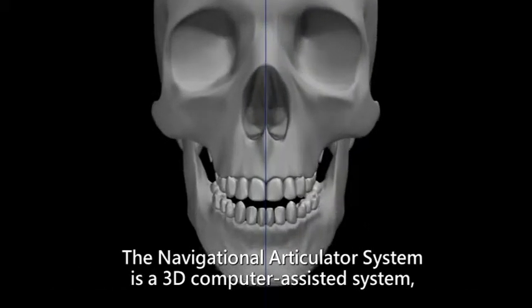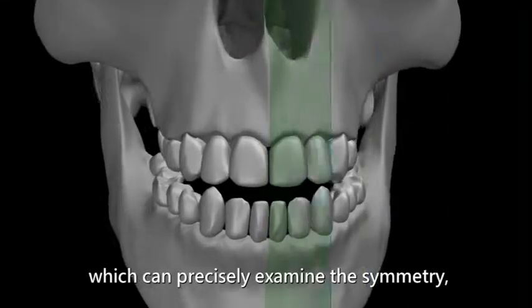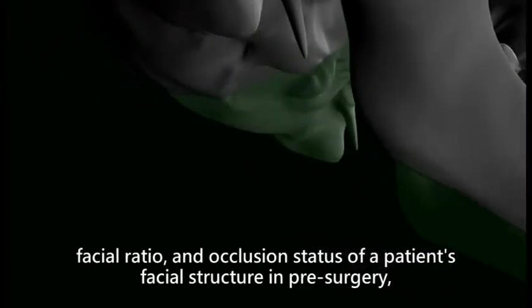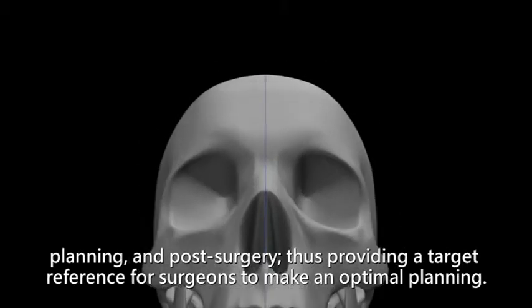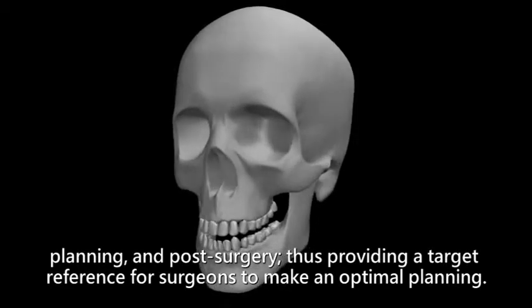The Navigational Articulator System is a 3D computer-assisted system, which can precisely examine the symmetry, facial ratio, and occlusion status of a patient's facial structure in pre-surgery, planning, and post-surgery, thus providing a target reference for surgeons to make an optimal planning.